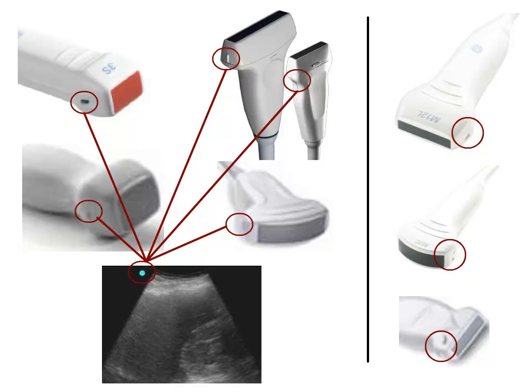So touching the face of the transducer and looking for movement at the surface of the picture is not an unusual way to determine marker orientation every time you are handling a different probe. This is not unusual, and we advise that you use the finger technique before you start using the probe.